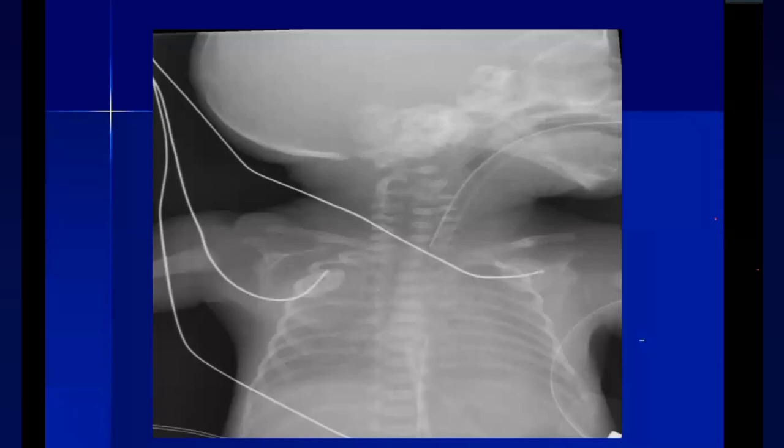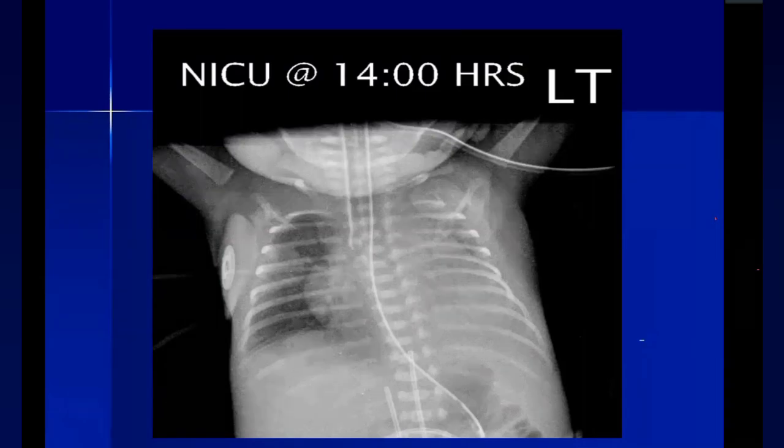And it's very important to know the age of the patient to tailor your differential diagnosis. This is a few hours post installation of surfactant through the ETT. You can see improvement in the right lung, while the left lung is not improving yet. So anyone can see why this happens. If there is a follow-up after like 12 hours, the neonatologist tells you that I already started giving inhalers. So what do you think? Why is the right lung improving while the left lung is not?